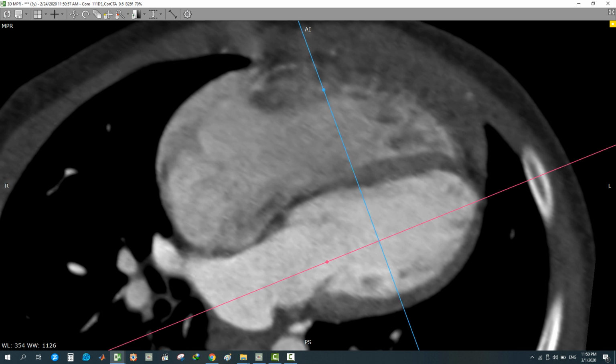As you see, I will explain rapidly. This is the right atrium, dilated, and this chamber is a mildly dilated, hypertrophied right ventricle, and this one the left atrium, average size, and this one the left ventricle, average size by eyeballing. I will remove the crisscross lines like this. I will save this image by pressing save image.